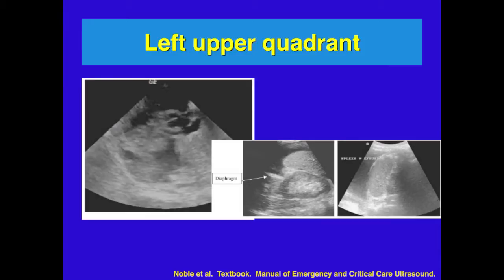Here you see some pictures, some still images. On this side, sometimes it's not as easy, since the patients that have this have ruptured spleens and it's hard to see the anatomical borders.